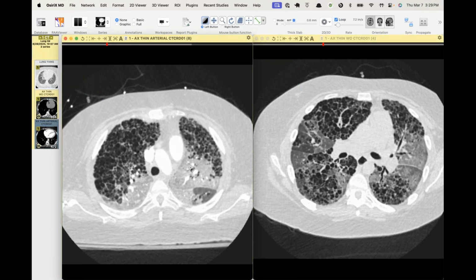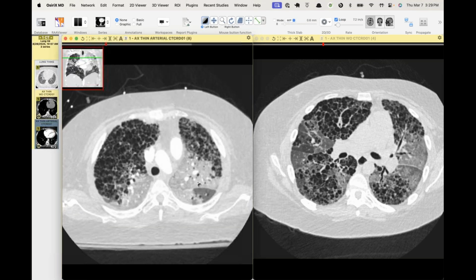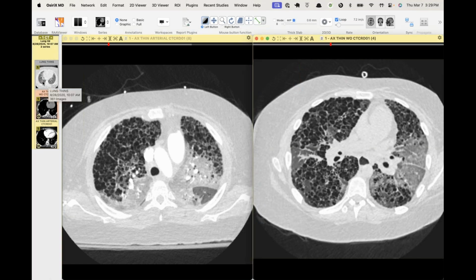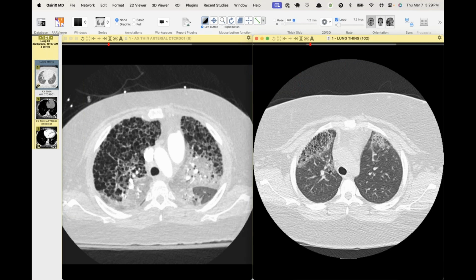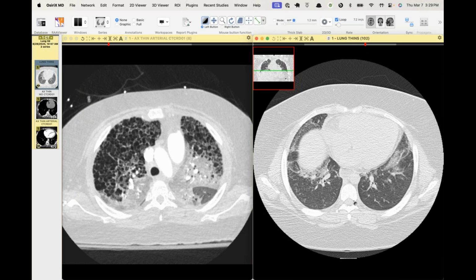I think some of the areas being relatively spared argue against that, but the earlier image that you showed us was very similar to the ones that were published in that paper, where you had these focal lesions that contain cystic spaces, just like that. Wow. Yeah.